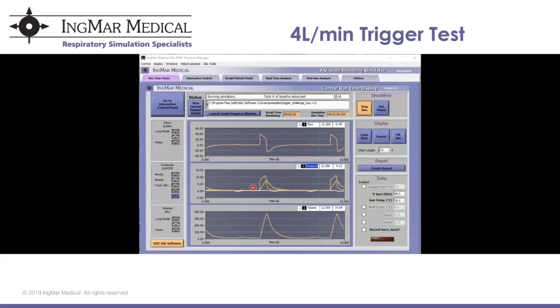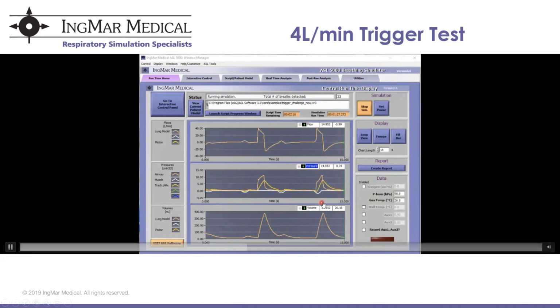You can see how the ventilator just delivers its 8 breaths per minute, but there is no trigger yet. And again, still not. You can see how much longer it will take now. Oh, here we go. Finally, the ventilator can recognize it. And you can see that the effort that was needed is a little bit bigger than in our first experiment.